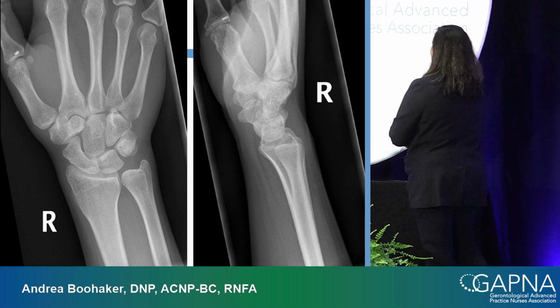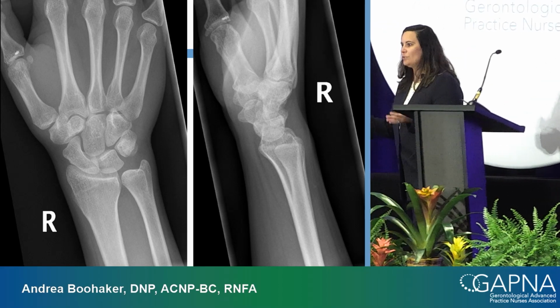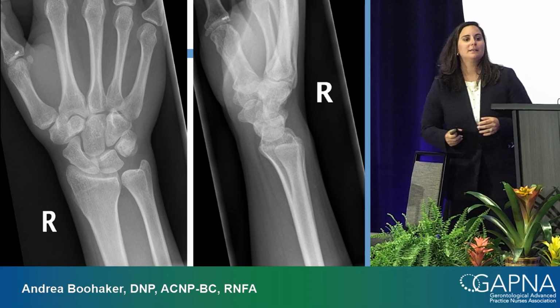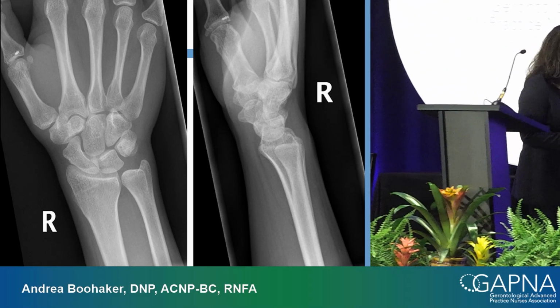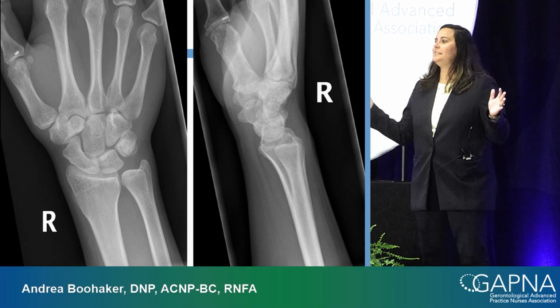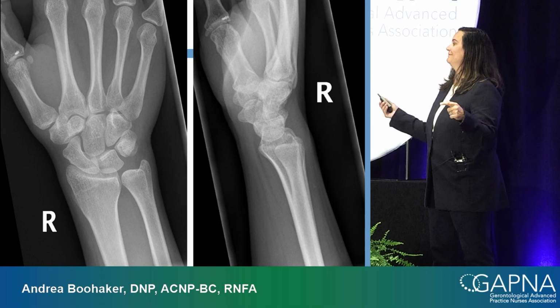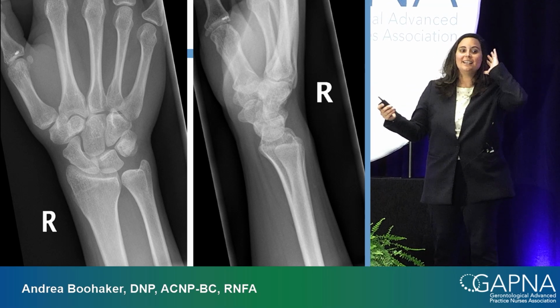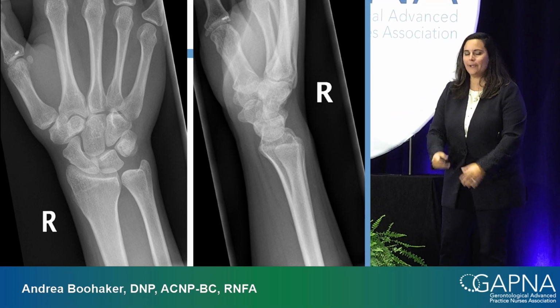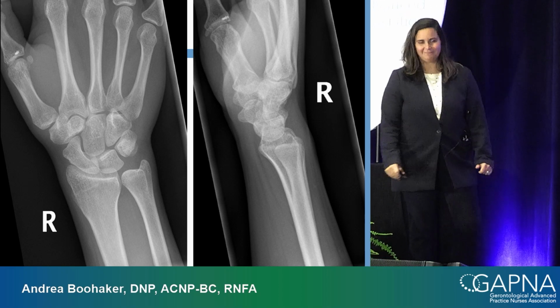Who wants to take a stab at this as far as describing what you see? Displaced? Okay, who else? Just yell it out. Come on now. I'm going to start calling on y'all. Ulnar, okay? Okay, let me help you out. This is a normal x-ray.